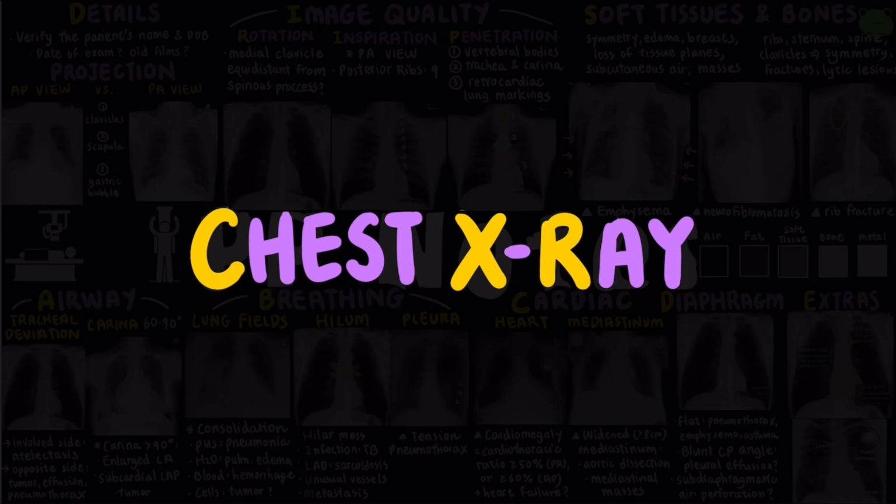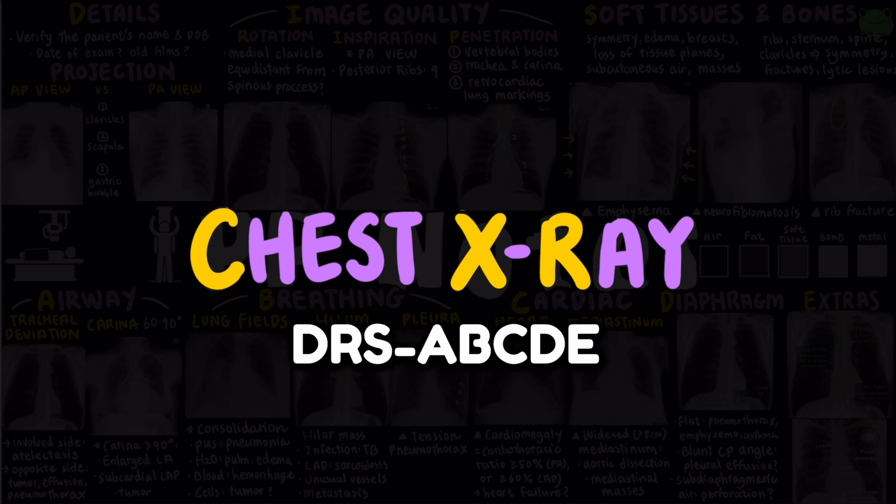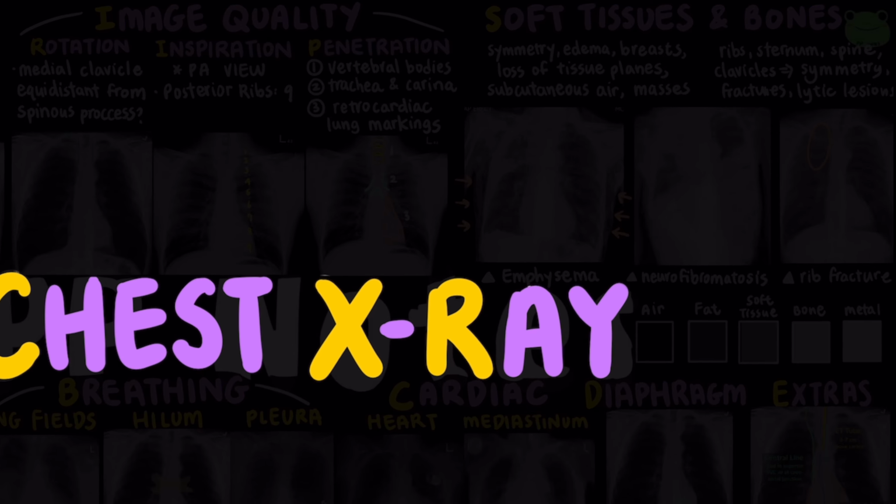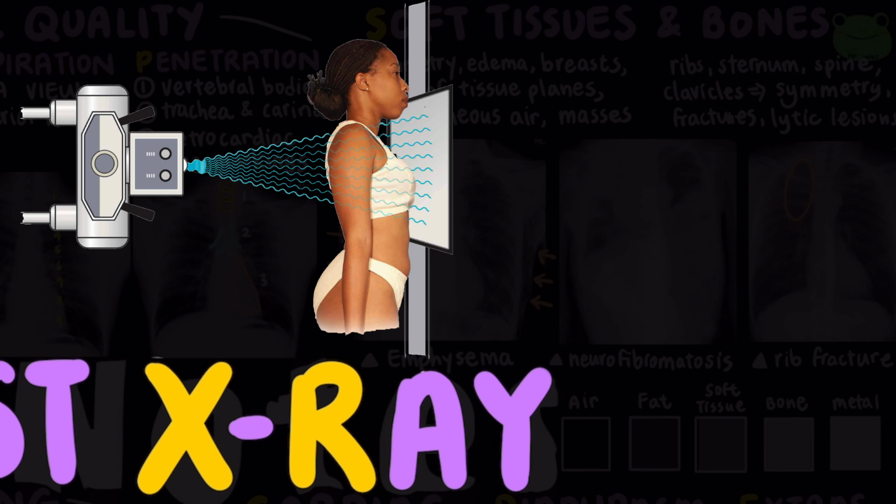Today we're going to learn how to systematically read a chest x-ray using the DRS-ABCDE method. Before we start reading chest x-rays, here's a quick look at how they work. X-rays pass through the body and get absorbed differently depending on the tissue density. The denser the tissue, the whiter it appears.